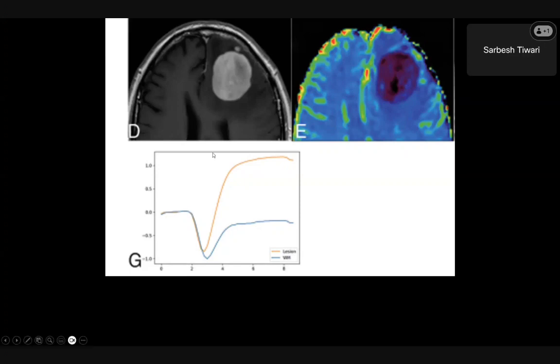All right, and you get a high lipid peak and an elevated choline ratio. Case 8, again a very easy one. A 7-year-old boy with features of raised intracranial pressure. Complete diagnosis in this particular case. So you are seeing a T2. I told you it's an easy case, so I know it's medulloblastoma. Give me a complete diagnosis. You guys are doing very good, so I expect you to answer better here.